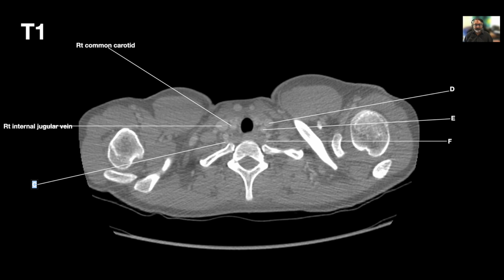And at that level, it seems to be a right vertebral. Correct. Artery or vein? Well, it's posterior, so the artery. Correct. And can you tell the right vertebral vein? Yeah, just the bigger surface. That's absolutely correct. Very good. Okay, so D, internal jugular vein, I think.